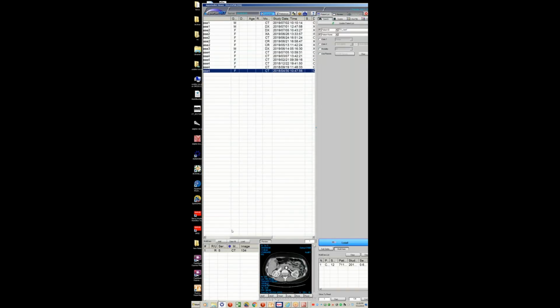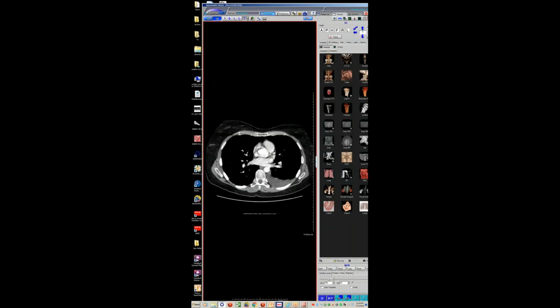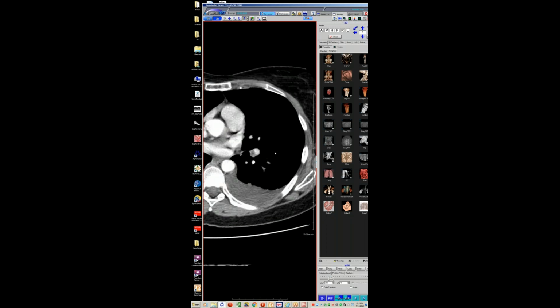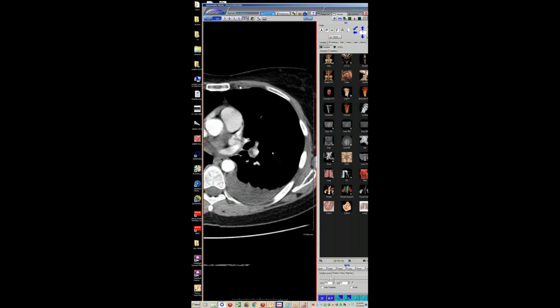But a very scary case, and this is the third case I've seen like this, where they start out like this, just growth along the side of a lobar or segmental vessel. So pretty scary case. Hey, Seth, quick question.